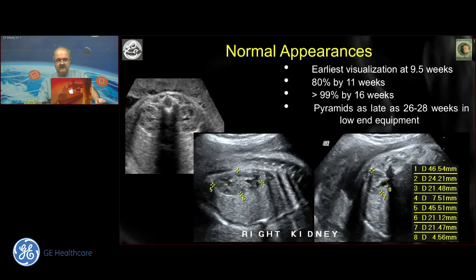The overall measurement of kidney size is done more as a matter of routine for comparison later on in case you find an abnormality. When you have a doubt on whether a kidney is hypoplastic or not, or in case you see an abnormal kidney such as an echogenic kidney, then we know that the differential diagnosis of a small echogenic kidney is quite different from that of a large echogenic kidney.